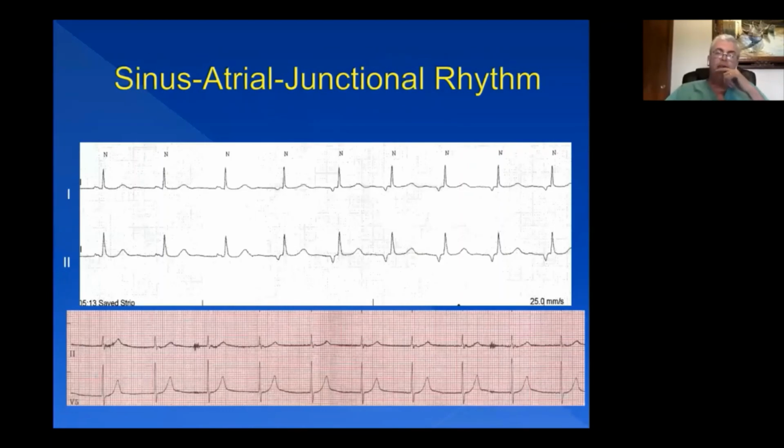Now, this is a good display. All these are our patients' strips, without violating any HIPAA. So this is ECG. You can see lead 1 and lead 2. Again, never forget the speed and the gain. In this case, you can see the speed, 25 millimeter per second. The QRS, you will get used to it. It is narrow. This is a big box. This is less than half a big box, narrow QRS. Options are sinus, atrial, or junctional. If we look for P wave, we can see P wave positive in lead 1, positive in lead 2. That's sinus. Keep going, keep going, keep going.